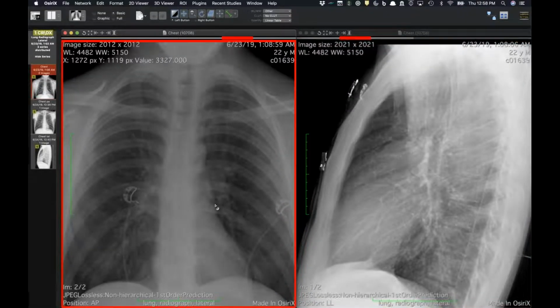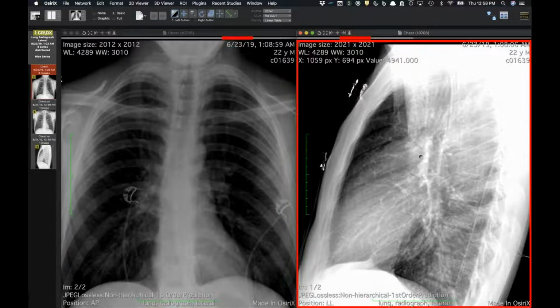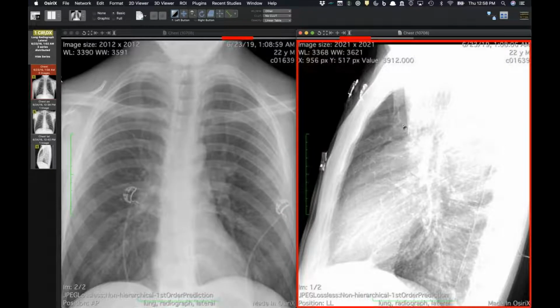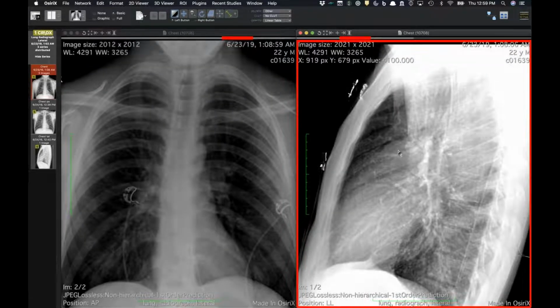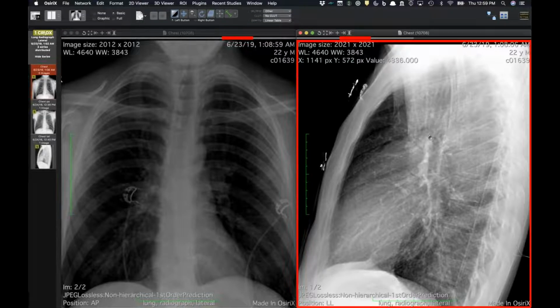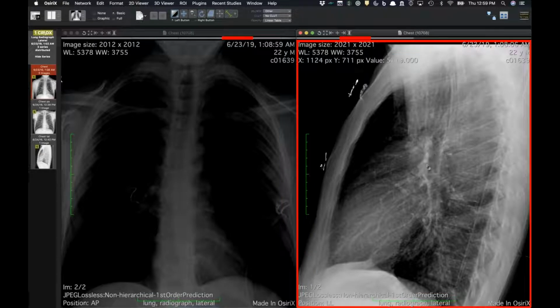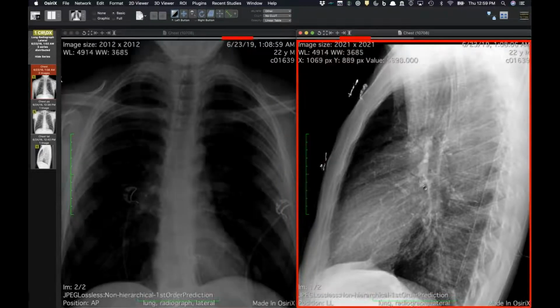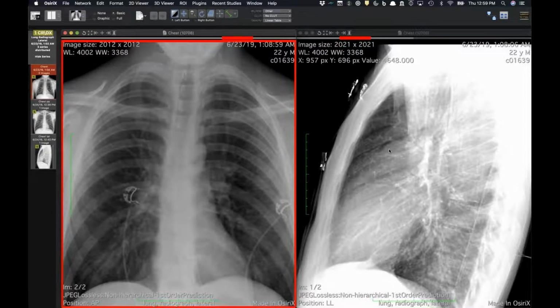Pneumomediastinum. Yeah, exactly. And I think it's really only the ring around the artery sign a little here and maybe a little bit along the aorta, a little bit up higher. And I think it's hard to tell if some of this is trachea or if it's just the scapulae overlying, but without a doubt. And it fit perfectly. They actually never did a CT, but the patient had severe coughing fits and had sudden onset of chest pain.